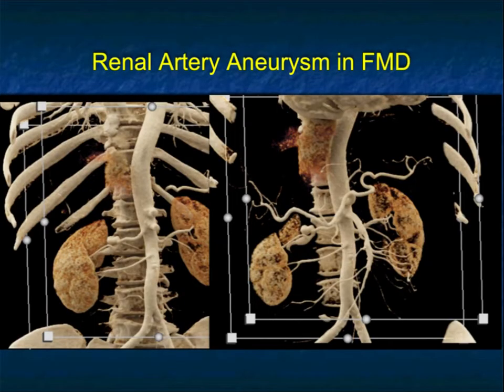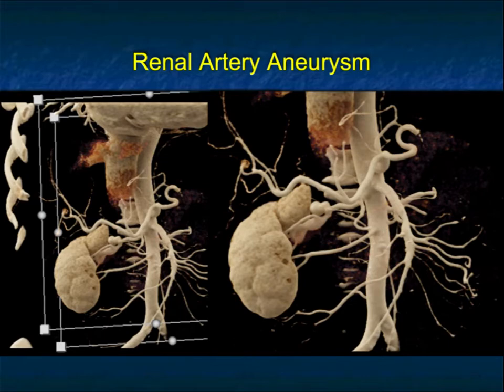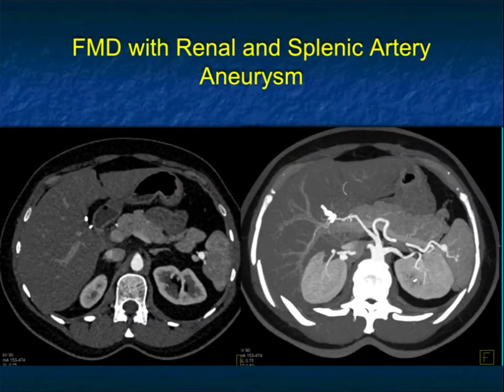Here's another patient, renal artery aneurysm, right renal artery, nicely shown on the cinematic rendering. This patient has 2 renal arteries; the bottom, more inferior one looks fine. You can see it very nicely here. You also see on the cinematic, splenic artery looks good, hepatic artery looks good, SMA looks good, branches of the SMA look fine. Two renal arteries, the more superior has that bilobed aneurysm.